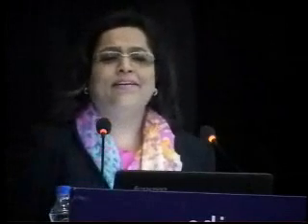Now why I'm saying this is, if you look very carefully, you think this is a sinus bradycardia? Yes or no? Dr. Agarwal is staring at me. Please hurry up. This is my last slide. He says my time is out.